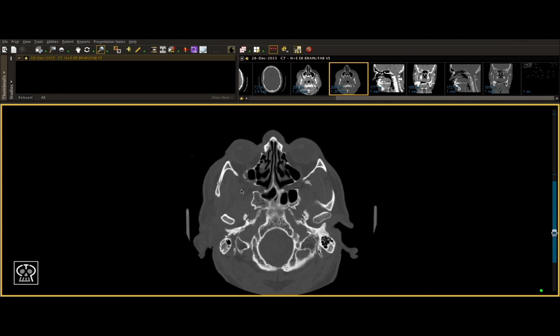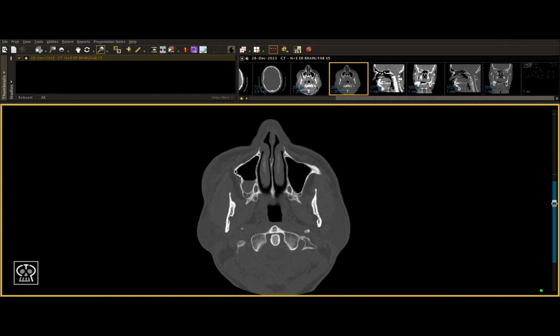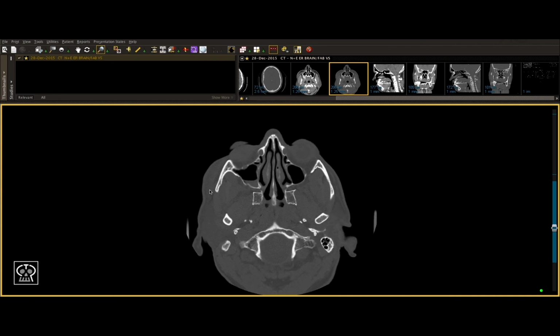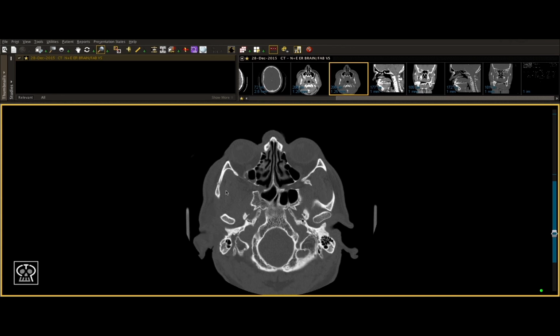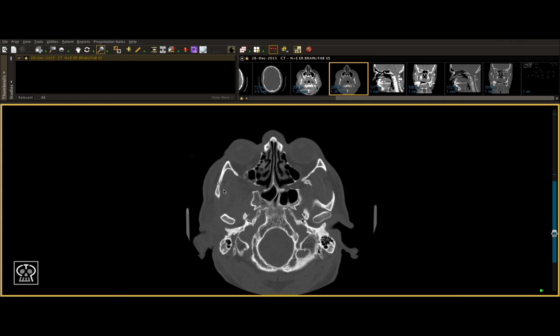After we finish with the sinus, starting from the bottom, we'll then go more posteriorly and look at our arch. As we follow it back, we can see here another fracture. However, as you can tell, it is minimally displaced, if displaced at all. It's quite in line, despite the bone being broken and a triangular defect here. So far we have a right posterolateral wall fracture and a right zygomatic arch fracture.